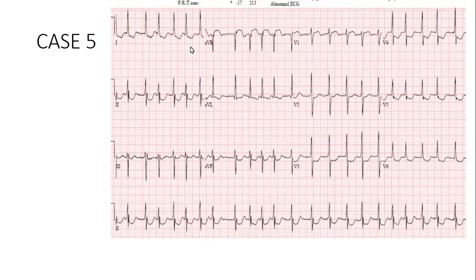Okay, Luna, please give me something. So what is this? Sure, difficult. I think it's a, oh my God. Let's see the present. My God, I'm not sure, really.